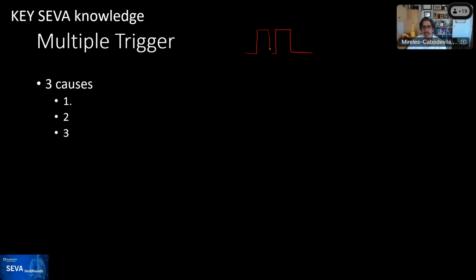That's what in general terms in the literature is called double trigger, or also you'll hear the term breath stacking.